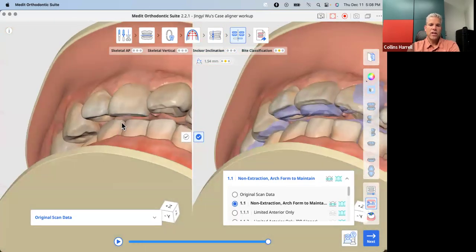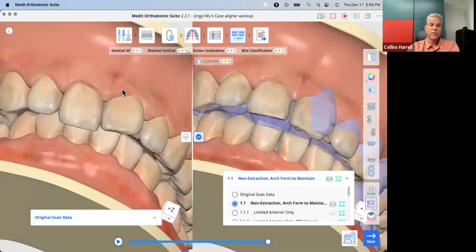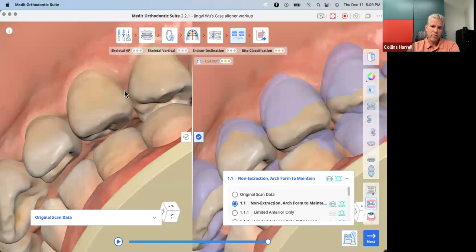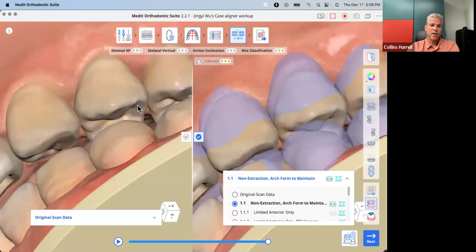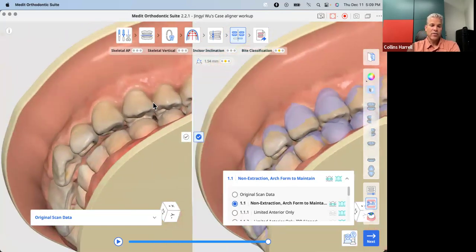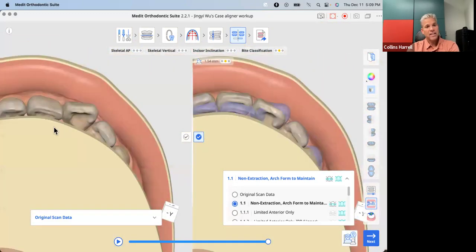And then you look at the overjet that's left, and this patient's teeth are a little bit tapered, so probably you're not going to have a lot of opportunity for upper anterior IPR. But once you get your canines retracted back as much as you can with posterior IPR, right on the distal of that canine, you might be able to take off 0.6 millimeters of tooth structure and then more between these bicuspids. So you could probably focus more on posterior IPR to get the canines back without getting the molars back any further. But with those tapered incisors, I'm not sure that you're going to have a lot of opportunity for anterior IPR. So I agree.